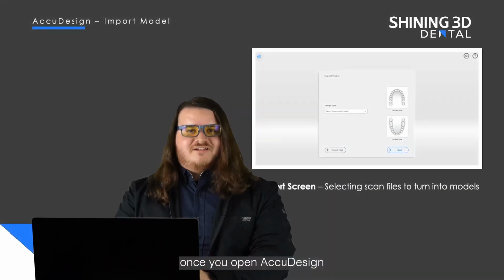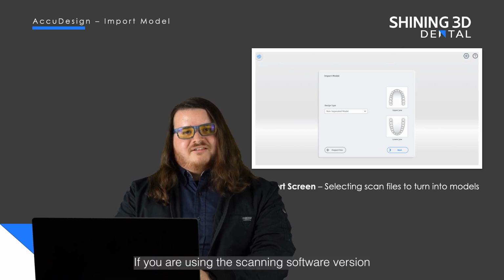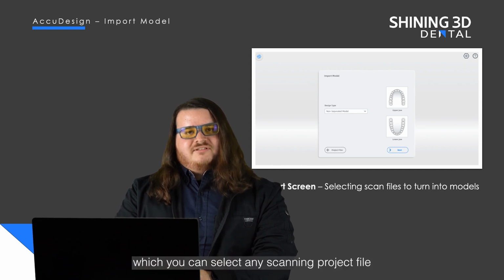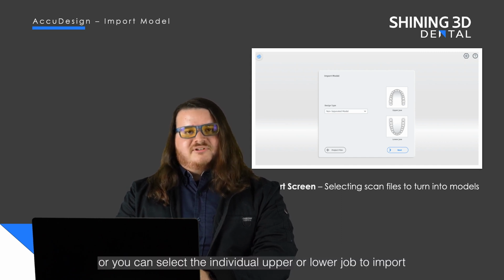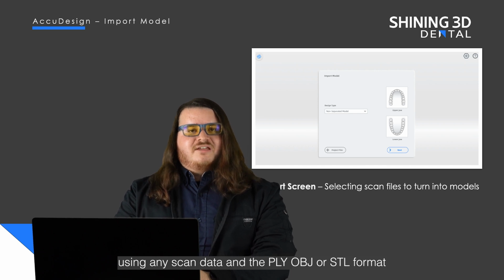Once you open AccuDesign, you'll be greeted with the Import Model screen. If you are using the scanning software version, you will already have your scan data imported into the module. If you're using AccuDesign, you'll have an Import Project Files button, which you can select any scanning project file from one of our scanning softwares. Or you can select the individual upper or lower jaw to import using any scan data in the PLY, OBJ, or STL format.